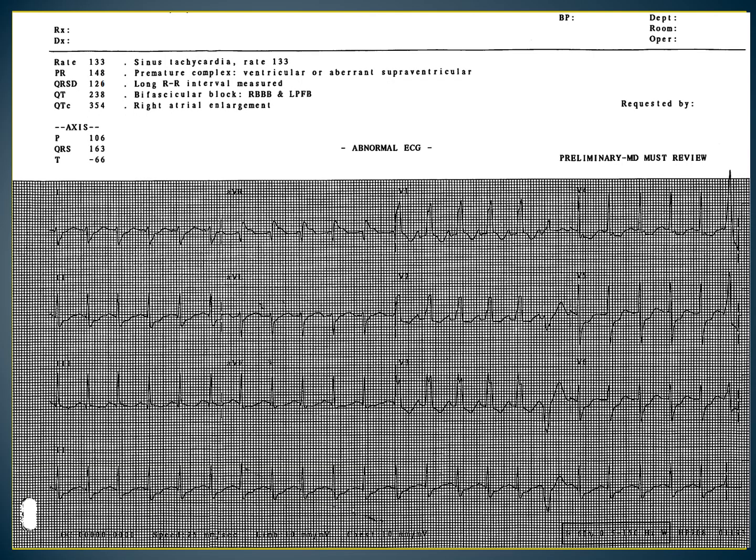Okay, so here's your next patient. Let's see how you do. Find out what the axis deviation is first. So we're going to look at lead 1, and it is primarily down. Lead 2 is upright, and lead 3 is upright. What's your axis deviation? If you said that you have a right axis deviation, you're correct. Does this indicate a hemiblock? Yes, it is a posterior hemiblock. Or you could say that the posterior fascicle on the left ventricle is currently blocked.